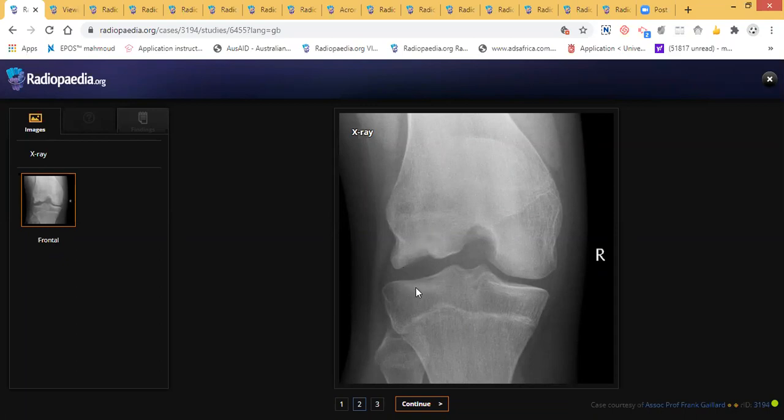So osteochondritis dissecans is one of the anatomy cases, and they have grades. I think this one, maybe with this sclerosis and abnormal changes with osteoarthritis, is in a late or advanced stage. So this one is OCD.